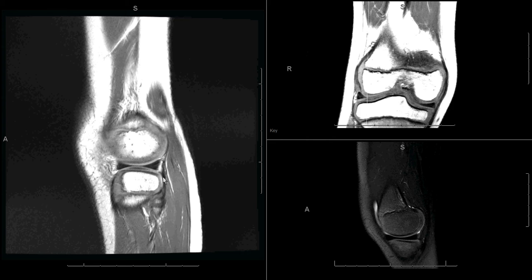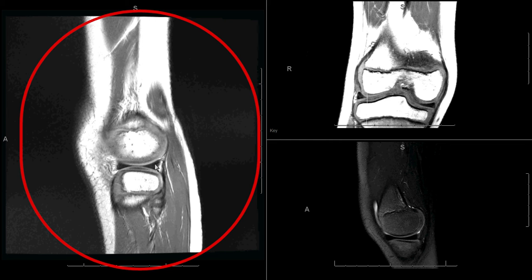The meniscal tears are graded in the same way as in the adult population, and you want to determine if you have a line that is exiting the articular surface. You talk about vertical or horizontal or radial tears through the meniscus. But there is one type of meniscal tear that is more particular to pediatrics, which we'll address in the next section.